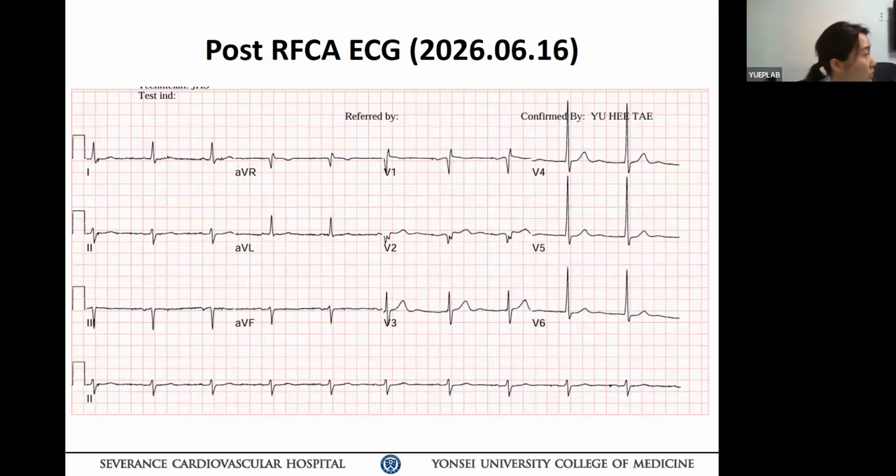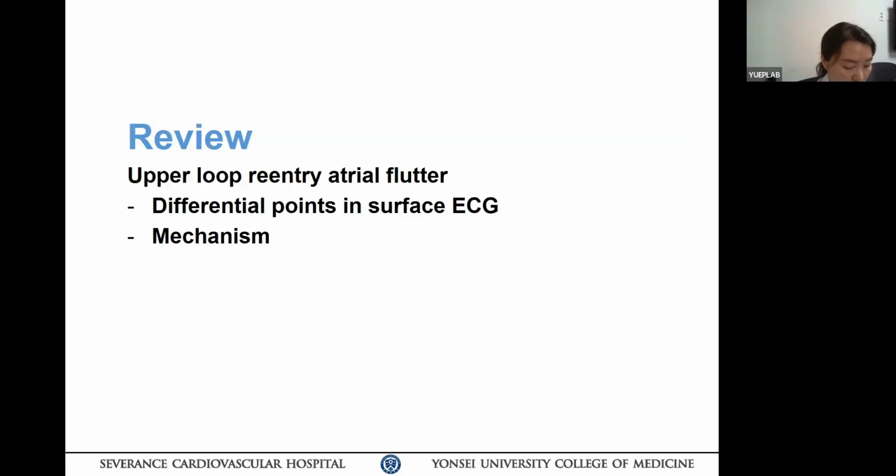And this was the post-RFCA ECG with sinus rhythm. So I brought some review about upper loop reentry atrial flutter.